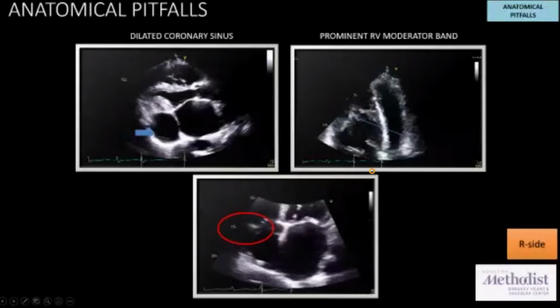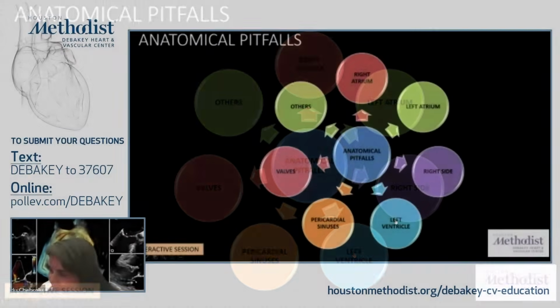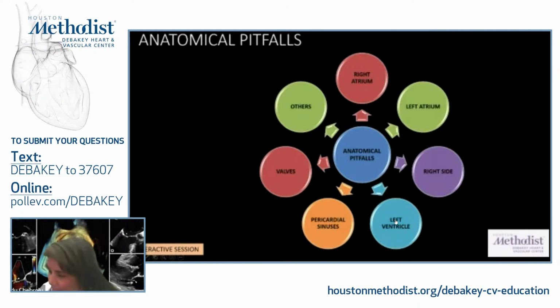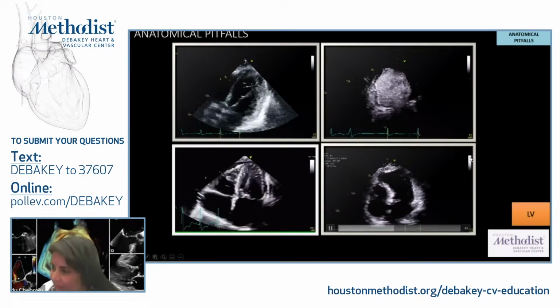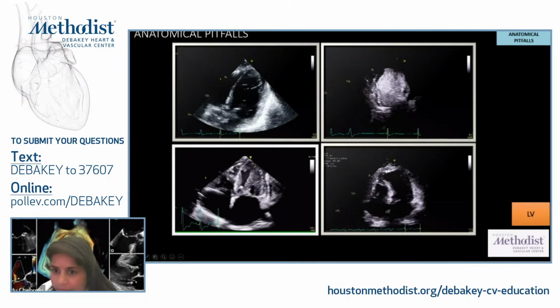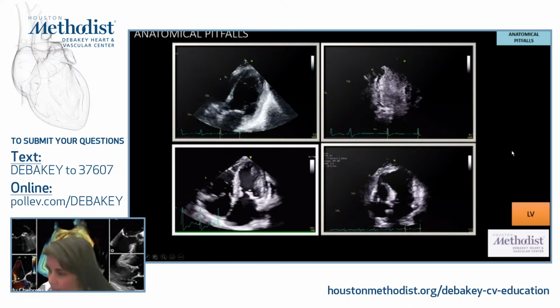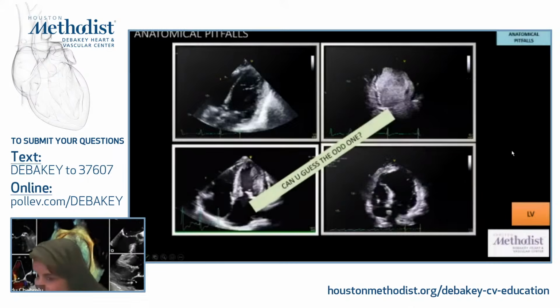All right, so let's move on to some other anatomical pitfalls. I know these are interesting things we actually encounter on a daily basis, but we don't think about them quite often. All right, let's see if any of you can guess this one. Can you guess the odd one in this?